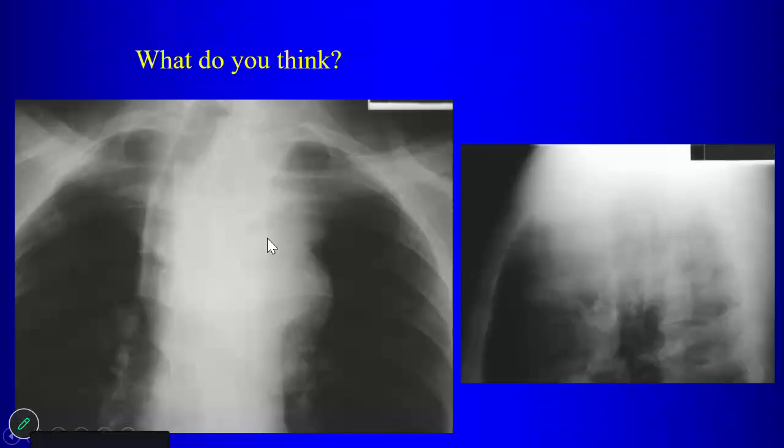Occasionally, you might have massive lymphadenopathy that might simulate this, but the first thing you have to think about is thyroid masses. And then there's another finding on the film. As you follow the lateral border of this mass up towards the neck, what do you notice about it?